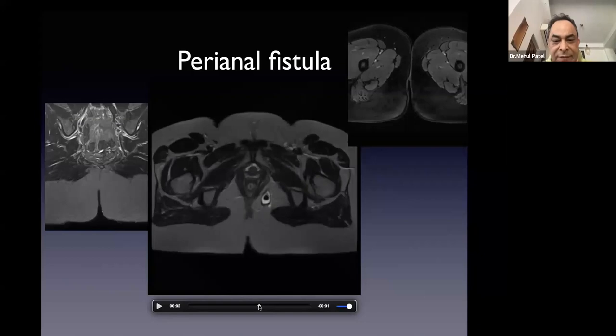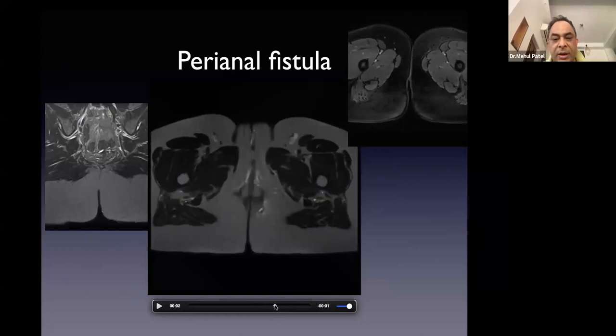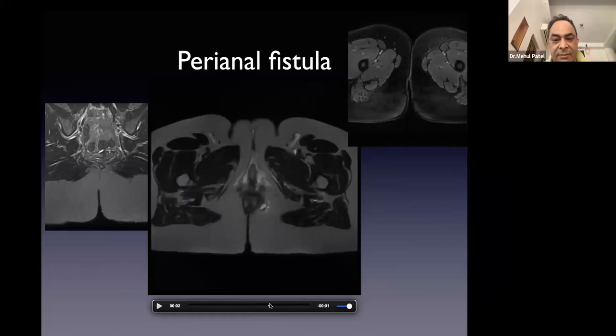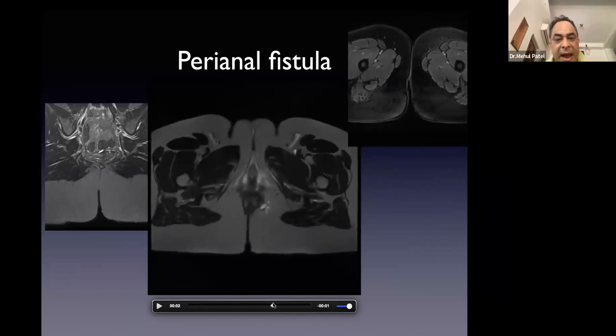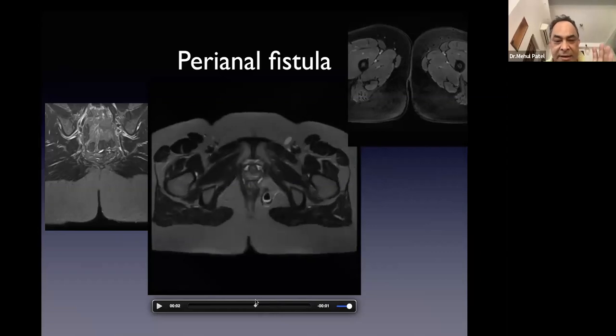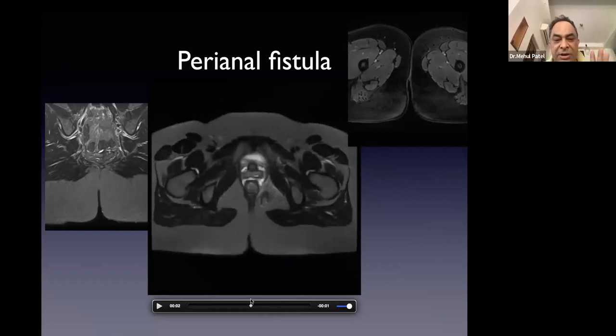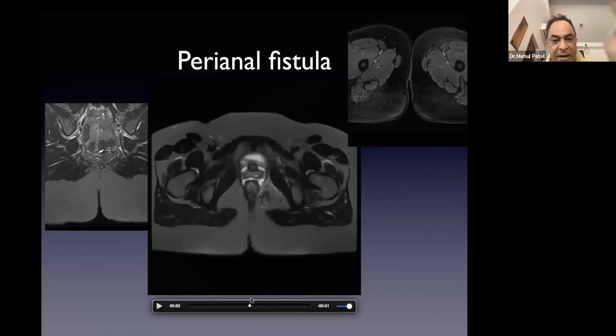Okay. So if you follow the primary tract from below, this is the natal cleft. It starts just to the left of the midline, goes anteriorly and cranially, staying outside the body of the left external sphincter. And we do not actually see it opening internally yet. Now it is going across the ischial fossa and possibly turning downwards.